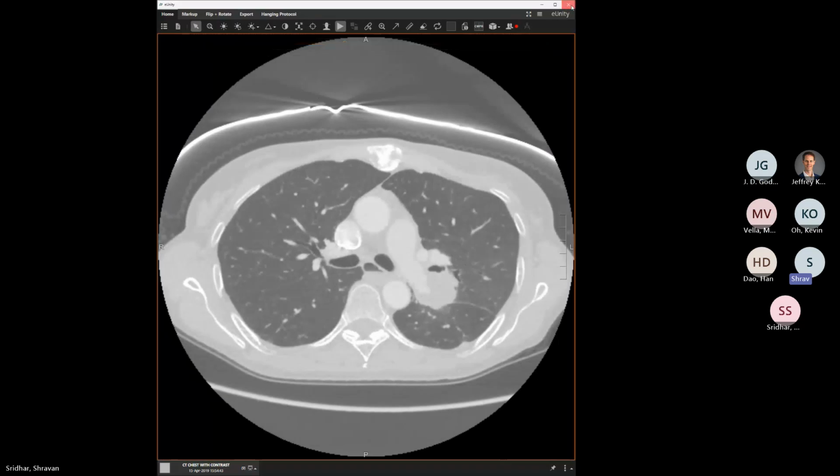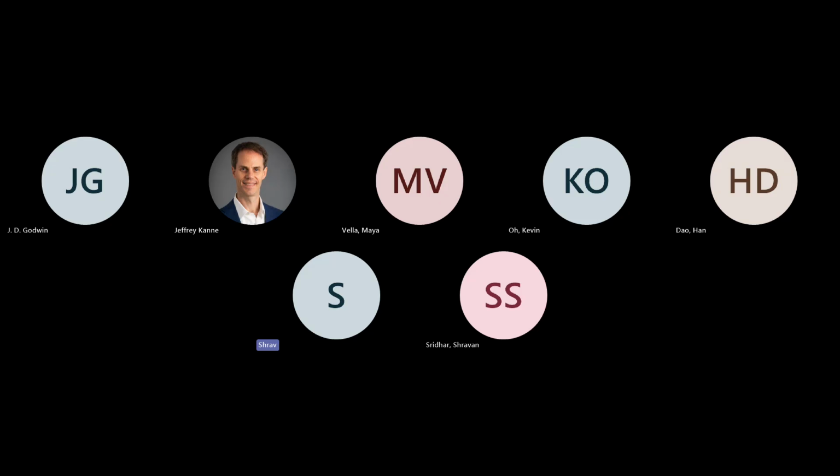Now that's not the interesting part. The interesting part comes a little bit later. So then the patient goes on to have a PET CT, probably a year after the intimal sarcoma was resected. The patient had a pneumonectomy on the left. And so here we just see normal activity along the atrium, and there's no activity at the operative bed or anywhere in the thorax. So it looks like a normal follow-up PET CT.